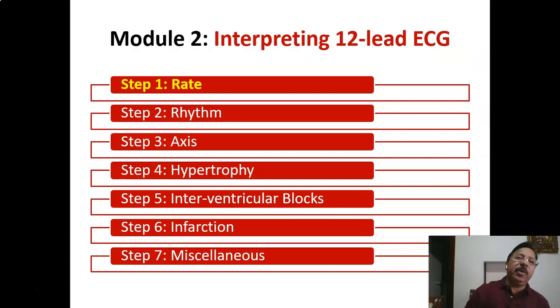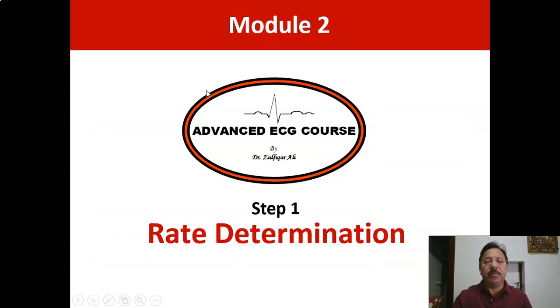Okay, so after this brief sensitization on how to read an ECG, let's go through this stepwise approach, going through each step one by one. So the first step of ECG interpretation is rate determination.